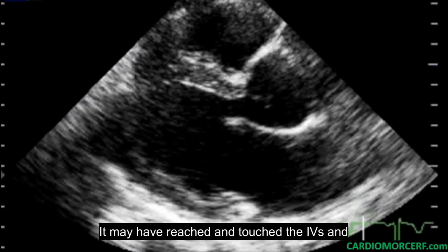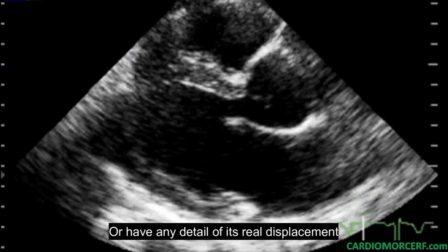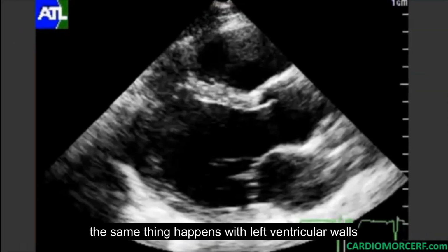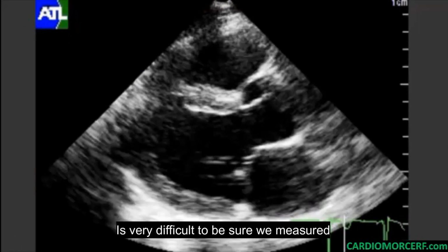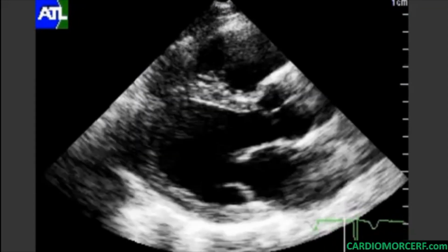It may have reached and touched the IVS and might be just returning from it. Moreover, I do not know its maximal excursion or have any detail of its real displacement through time. The same thing happens with the left ventricular wall. It is very difficult to be sure we measured the longest short axis diameter.